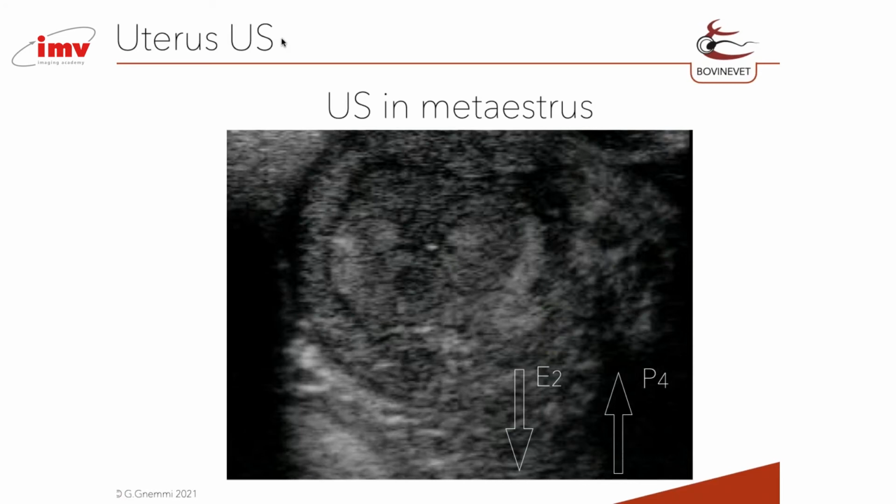Well, can we distinguish between the dominant follicles by ultrasound? No. Also working with the Doppler. But what we can analyze is the different hormonal profiles in the two different windows. At day 14, we are at the end of the diestrus, so progesterone is the main hormone. While at day 18, the main steroid hormones are the estrogens.